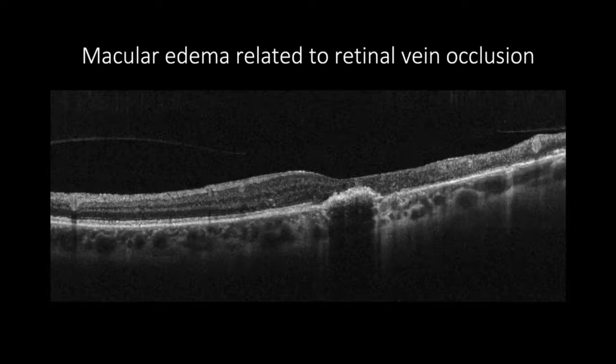In ischemic maculopathies, there would be a thinning in inner retinal layers. This applies in diabetic maculopathy and retinopathy as well. And sometimes OCT can show the occluded vessel as a hyperreflective circle. However, OCT shouldn't replace fluorescein angiography or OCT angiography in the diagnosis of ischemia. Some cases can present with RPE changes that may cast a shadow artifact, which can hold poor visual prognosis.